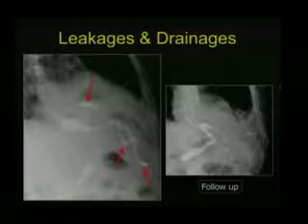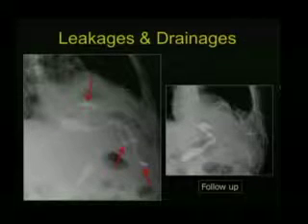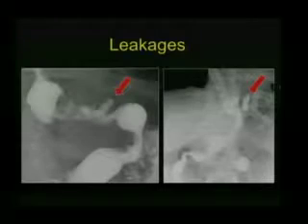This is another picture of the same patient after the treatment, follow-up. So this patient lost weight, definitely. Okay, this is another leakage. This is the gastric pouch, this is the rest of the stomach, and there is another leakage after the surgery. But in other cases, this could be a different complication.